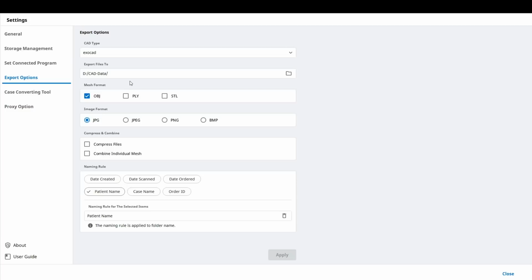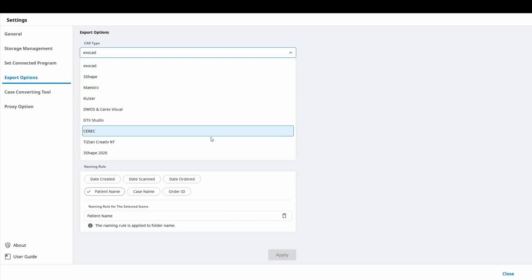It can draw the face scan from a handheld device that does face scanning for you. It can preload things. So it really ramps up and speeds up the design of software and facilitates the CAD program. And you have multiple different CAD software that you can link to the imaging platform and the Medit scan.